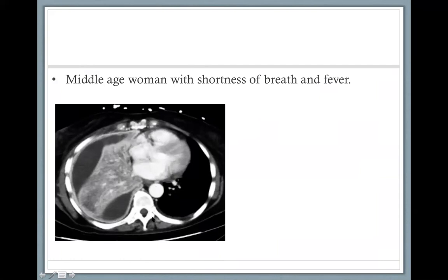The heart, the muscles. We're looking at the lung, we're able to see it, but I'll tell you in a minute why. And with or without contrast? Yeah, with contrast. So that's great. So this is a CT chest image in the axial plane, soft tissue window with contrast. So that's a good description of the study.